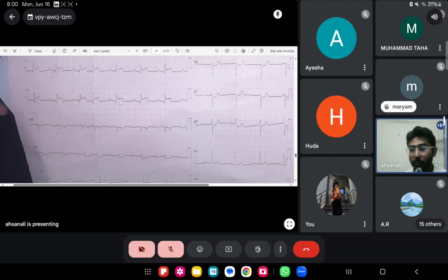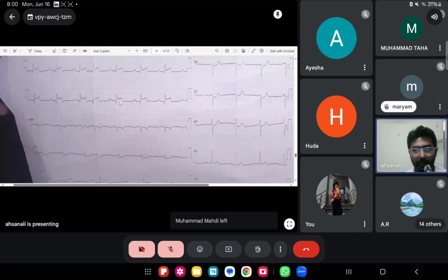Looking at the ECG, again you are going to check for the normal calibration, which is given somewhere here on the lower side, which is normal, I guess. And you are going to check for the rate. So if you start counting here, 300, 150, 100, 75, 60. All right. The heart rate is normal. Regarding the rhythm, there is a P wave, which is sinus, and it is regular and rhythmic. The QRS complexes are falling on the same side.